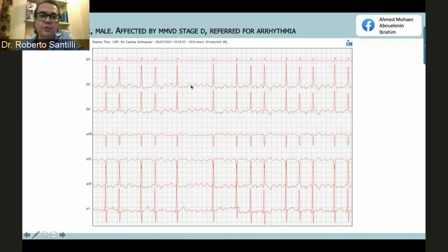The other thing that you have to do right away is to measure the FF interval. Remember, in our experience, all dogs that have an anatomical atrial flutter should have an atrial rate less than 500 beats per minute. This is very, very important, because you can have something that looks similar to this in paroxysmal atrial fibrillation, but the rate is above 500 beats per minute. So be careful, because I've seen cases with an incorrect diagnosis of atrial flutter, and it's not.